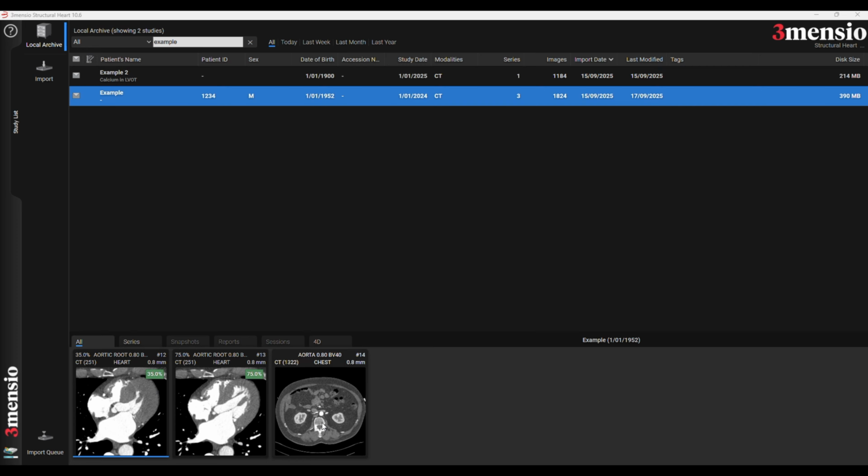So this patient has two series available for the aortic section. It's a systolic and a diastolic. And then we also have the access CT. We can scroll up and down and see the extent of that series. We can also change the contrast and brightness. However, just remembering this is not how we actually start the case. It's just seeing what's available to you.